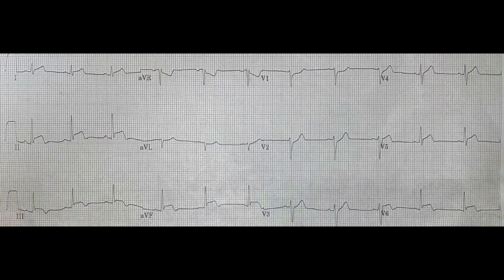All right, taking a look at this 12 lead, let me give you just a little bit of a backstory. Our patient was a male in his early 20s. In 2, 3, and AVF, you do see some elevation. And I will say this is just one of the 12 leads I got. It definitely progressed over time.